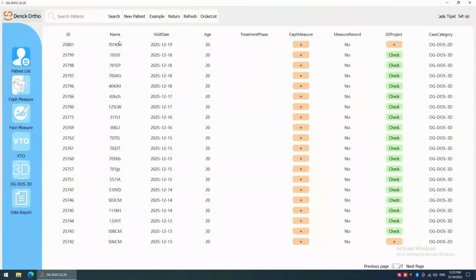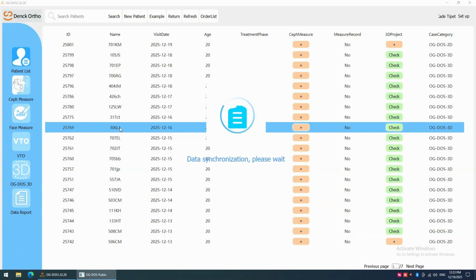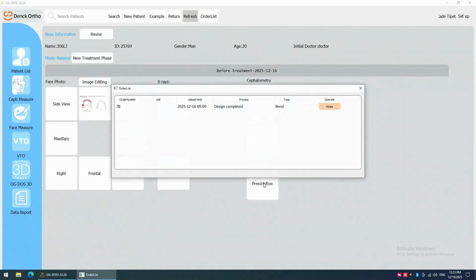And how you do this is return, and you're going to go, let's refresh. And so again, this is your patient files. I'm just going to look at my pan number here. So this is your patient files, your patient list, as you can see over here. And if I go to this one, I'm just double checking. So if I double click that, you're going to see that this changes.